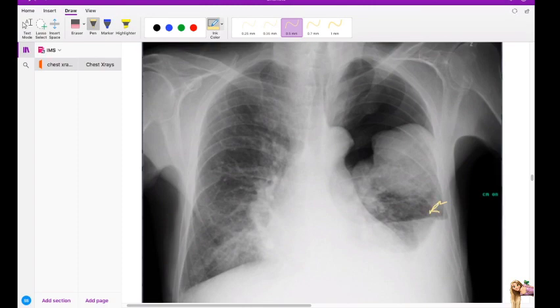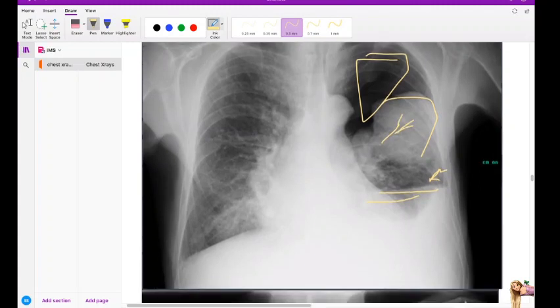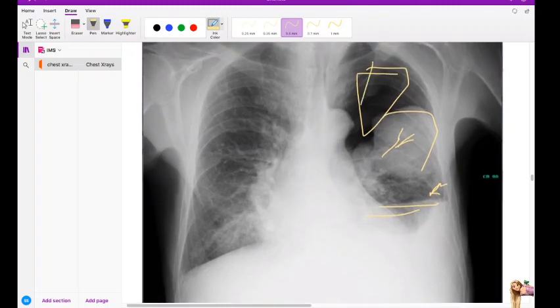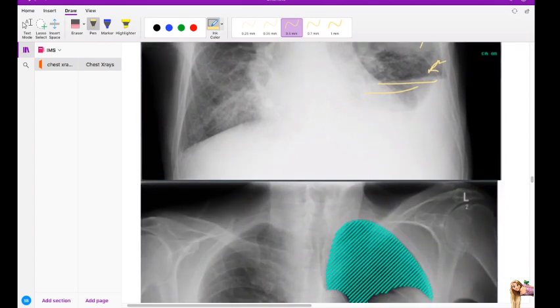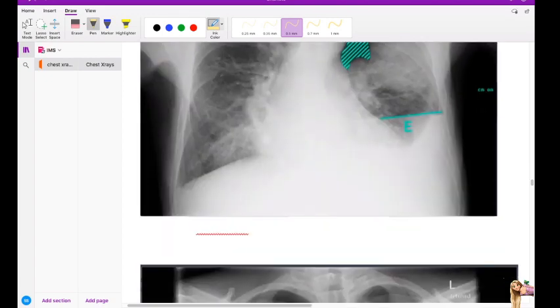Because of the atelectasis, the diaphragm just comes upwards, so the diaphragm looks more horizontal over here. And there's a pneumothorax over here. Not pneumonia, this is the lung. It's not considered consolidation. If it was pneumonia, you would be supposed to see air bronchogram. So that's the pneumothorax, and this is elevation of the diaphragm.